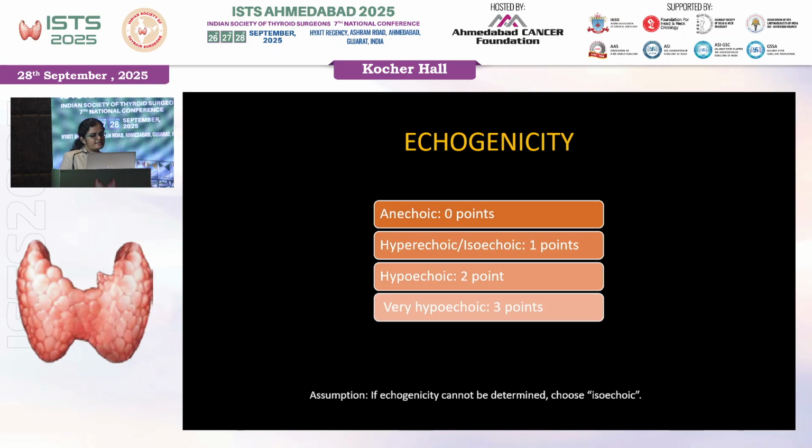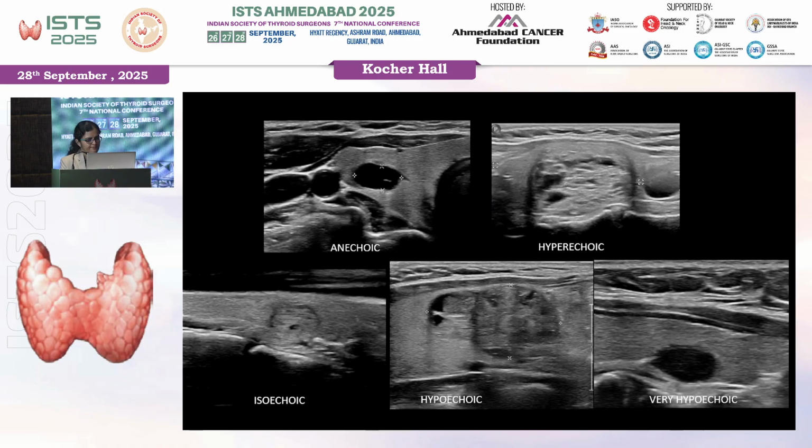Next is echogenicity. Again, anechoic receives 0 points, and the highest category, very hypoechoic, receives 3 points. And if you have doubt about which echogenicity it is, then we assume and give it isoechoic echogenicity and assign 1 point. So again, let us review each one of them.